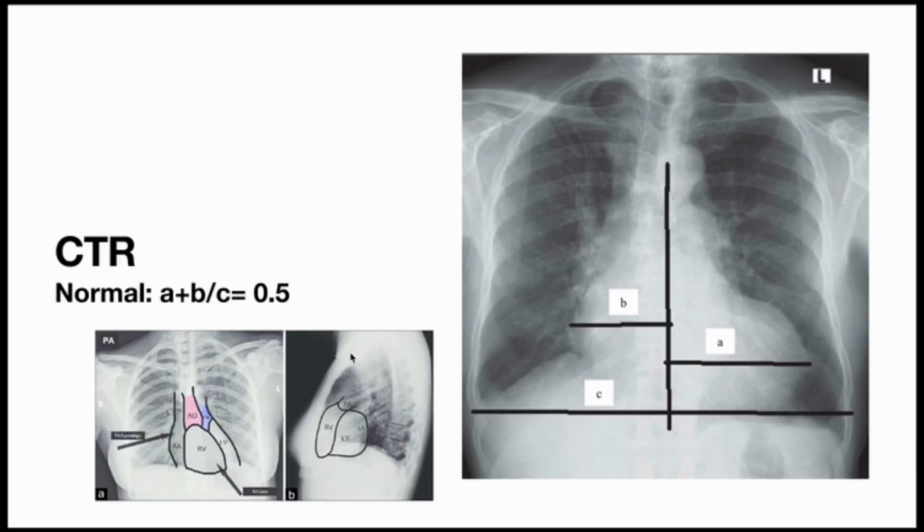Before we start, the anatomy is crucial. Someone must have taken a PA. We want a PA projection, because whenever we do an AP, you're going to get magnification. So if you are thinking about studying the heart, ensure that it's a PA view and the patient is not rotated. By that, we can comment confidently about the cardiac shadow sizes and shapes.